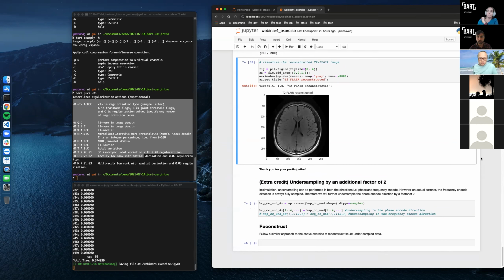Well, if I were debugging that issue, I would first take a look at the release notes for each of the versions and compare the release notes of the version that's working versus the one that's not, or working better. If that's not providing the information I need, the next level of debugging would be to run a diff, which is very easy to do in Git because BART is entirely version controlled.